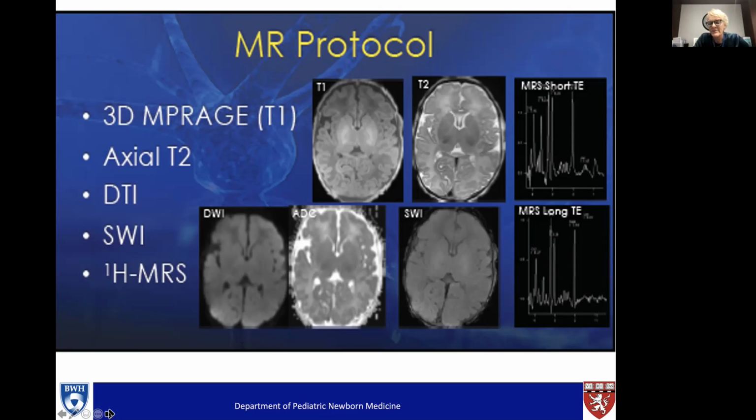Now, because sometimes the amount of water that's in the brain can affect how water moves around the brain, we correct that basic amount of information by getting rid of some of the changes that might be just structural water. And when we do that, we generate this map called the apparent diffusion coefficient, which is meant to correct for those difficulties and allow us to really see if water movement is being restricted, or there's been problems with local brain swelling or with brain cell death. And when we see that, there are big black areas, as we'll see on the apparent diffusion coefficient.